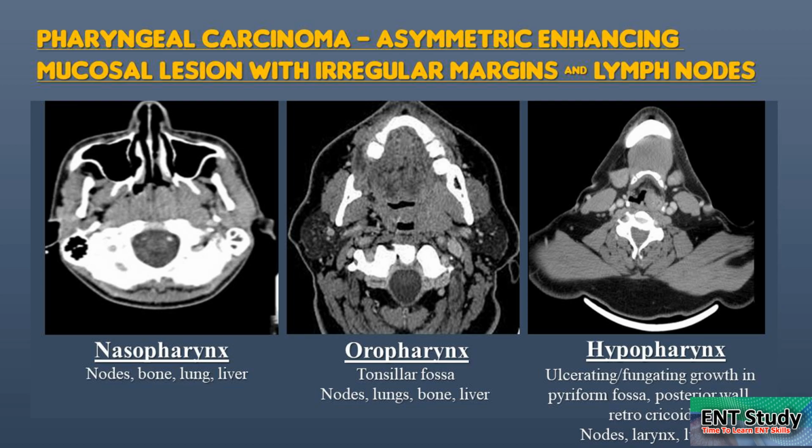On a contrast enhanced CT scan, always look at the normal side, the thinner side. I would identify the normal side by which side is thinner. So if there are whitish structures on this side, then there should be whitish structures on this side as well, like this. Why? Because these represent the intact vessels. And from there you decide if the tumor is extending around them, if they are clearly visible or completely absent. Like one case that Fahad showed, I was just wondering where have the vessels gone?